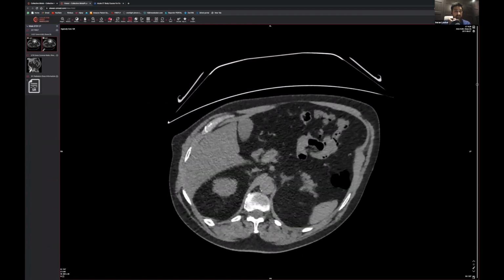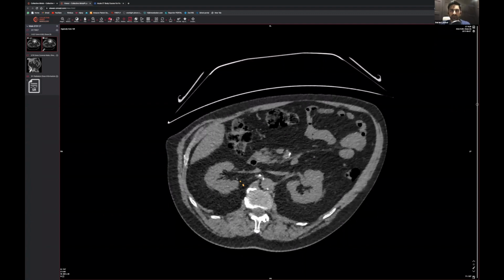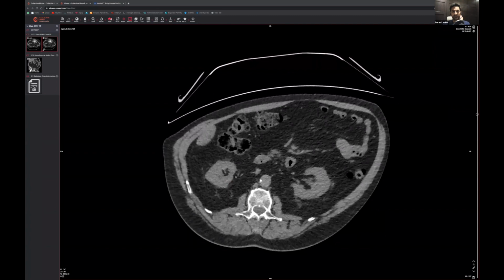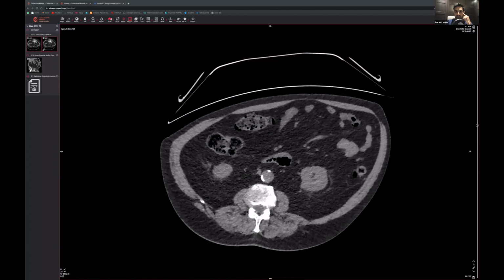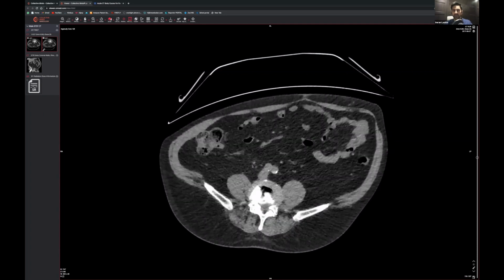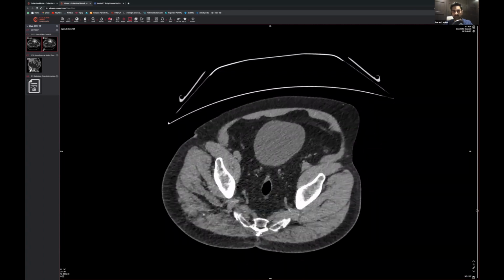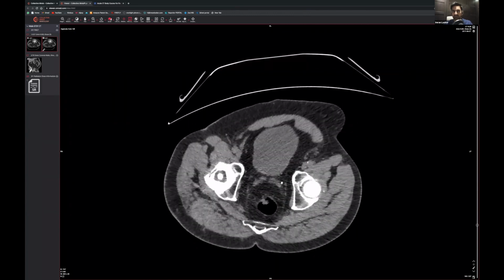And then the reason we did this is because we're thinking this patient's got a renal stone. But actually, it could be, but there's no renal tract obstruction because there's still fat around the hila bilaterally. So there's no backing up of the renal tract. But can you see here, that is going to be the ureter there, that little dot, and you've got to follow it. After a bit of practice, you can sort of anticipate where that renal tract will go, and you can see it going all the way into there. See that? So that's a vesico-ureteric junction. That's not a calculus.